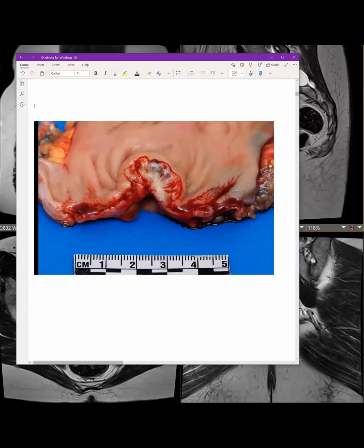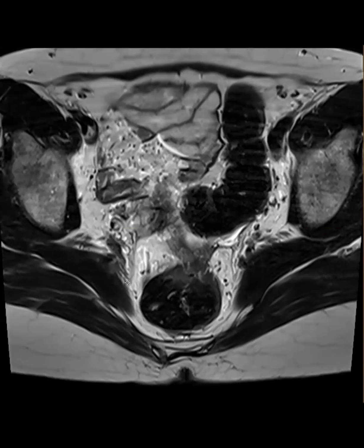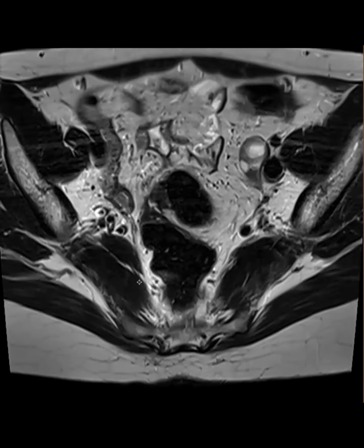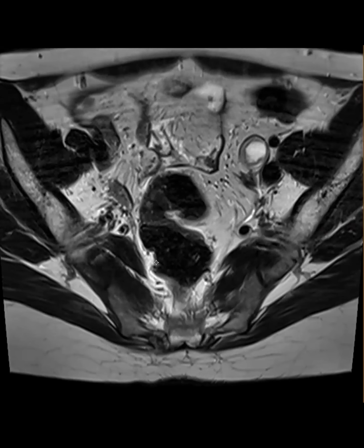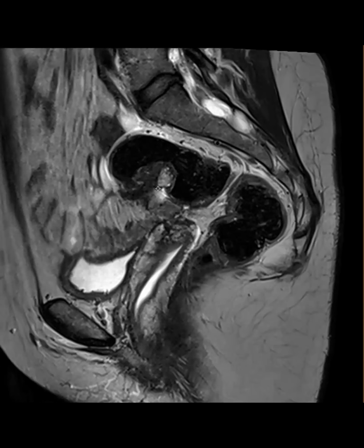So, Nelly, you've talked about how we have to describe the extent of wall disease and depth. So it sounds like in this case, did they end up doing just an anterior rectal resection, or did they remove the whole thing? They removed the segment entirely. So the colorectal surgery got involved. We meet with our gynecologist for endometriosis boards. So when there is rectal involvement, we say what circumference is involved. So in this case, it's annular or semi-annular, it's semi-annular.